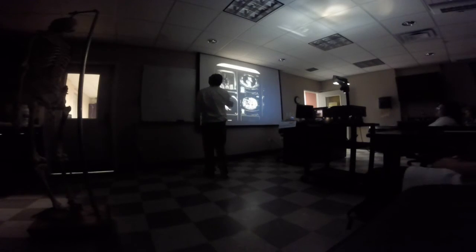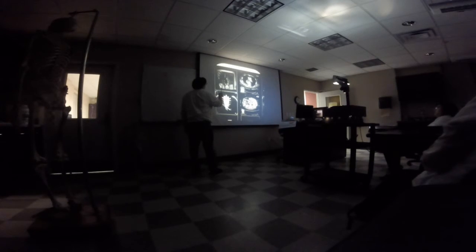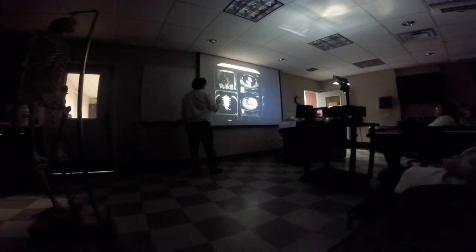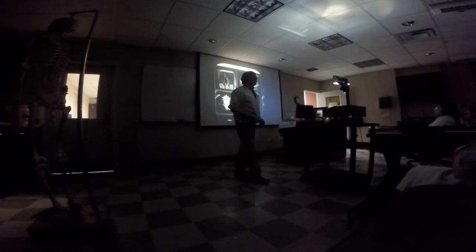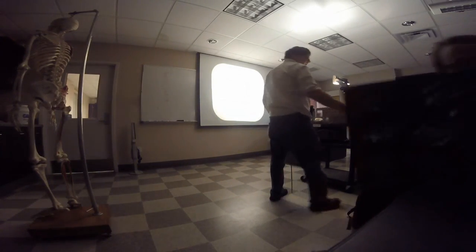What is the problem right here? Is that a chest? It's curved. This is the abdominal aorta, and it balloons out here. Oh, that's a big issue. That's a big old AAA, abdominal aortic aneurysm. AAA, not the car kind.